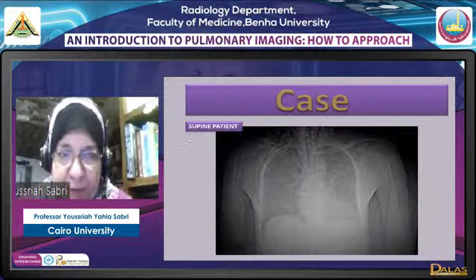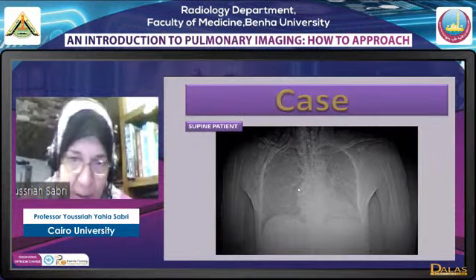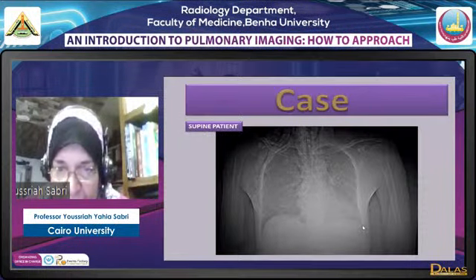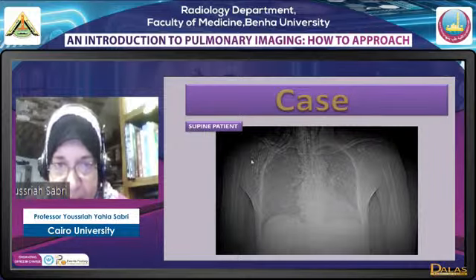Now this is another supine patient. This is a film paper, of course, an image from a paper. That's why it's not very nice. This is a normal costophrenic angle. This is the deep sulcus sign, and the patient also has surgical emphysema, as you see here.